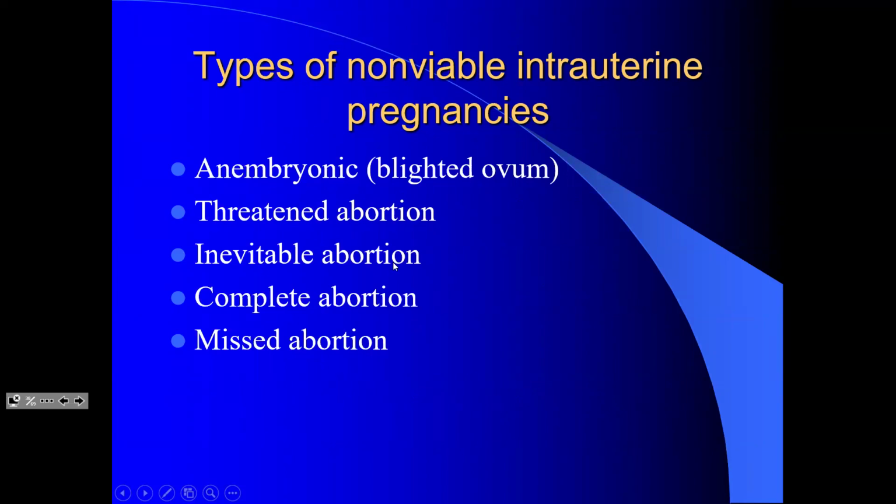Inevitable abortion means now there is no chance. The cervix is open and sooner or later, the baby is going to come out. You have no way to stop the abortion. Complete abortion means you don't see anything inside, but there was a pregnancy, or you had an ultrasound done earlier where there was a pregnancy.